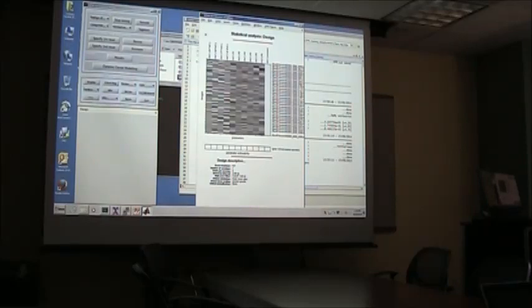This is the experiment that has famous and non-famous faces presented either for the first time or the second time. So this first column models the onset and duration of, I think, the non-famous faces presented for the first time. And this one, the non-famous faces presented for the second time. And convolved, you can see it's pretty small, but it's convolved with your basis, your HRF.